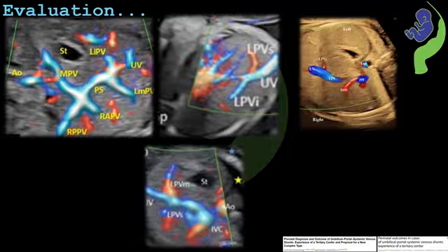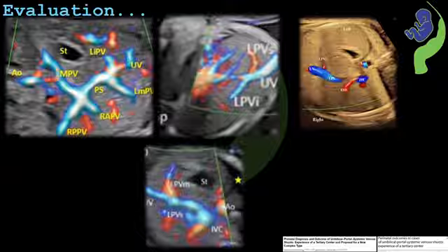In image 3, the umbilical vein is seen draining into the left portal vein. However, there is only one branch seen on the left side. The ductus venosus is not clearly visualized, and the typical appearance of the C curve of the left portal vein and the right portal vein is completely absent.